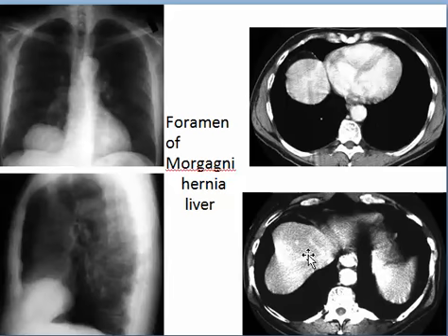Again, foramen of Morgagni hernia containing liver, right anteromedial, containing liver tissue.